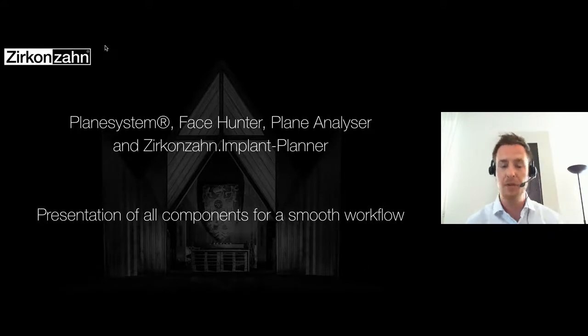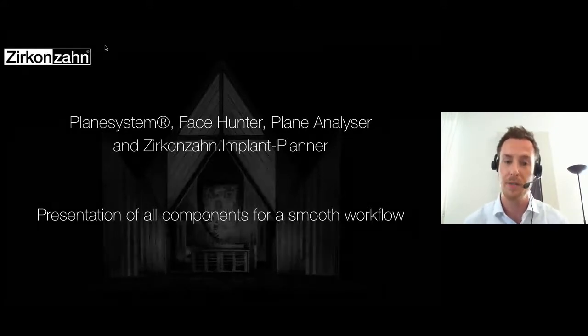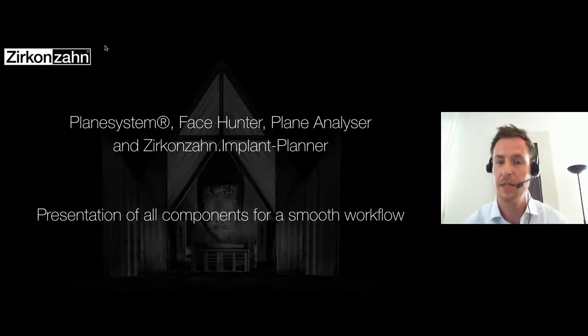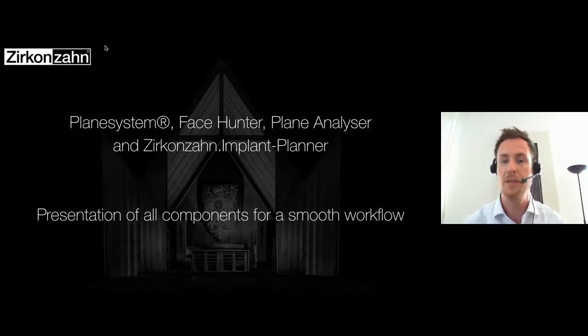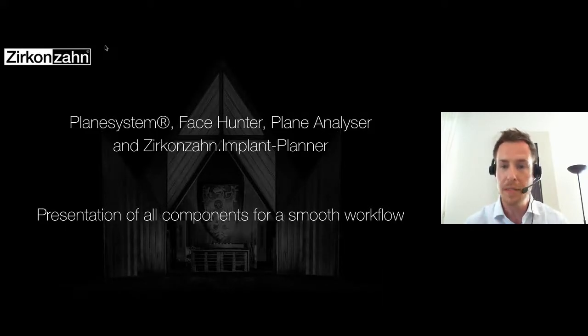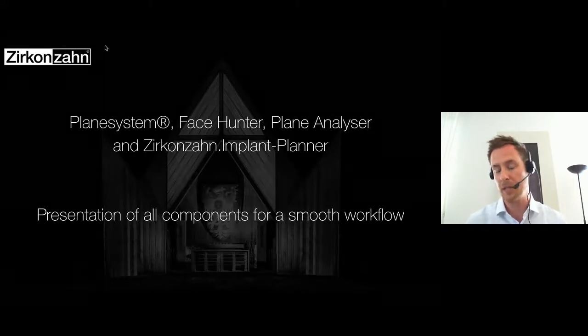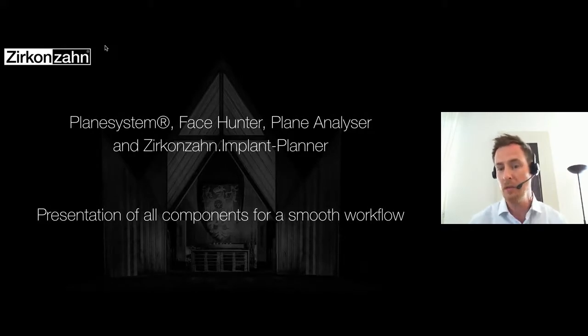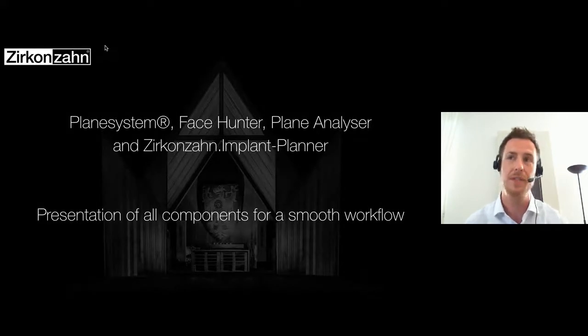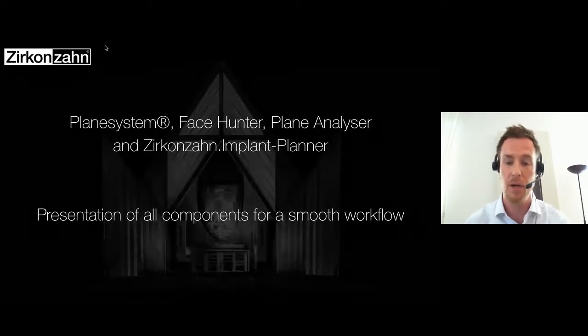For this kind of workflow, we use our special system called Plane System, and a 3D facial scanner called Face Hunter. And what is quite new is a device to record the mandible movements. This device is called Plane Analyzer. I also have a special part I want to show you. It contains our implant planner as well to create a backward planning. And for that, I also have a nice solution to create an immediate workflow.